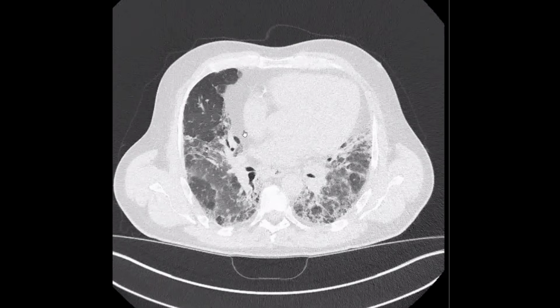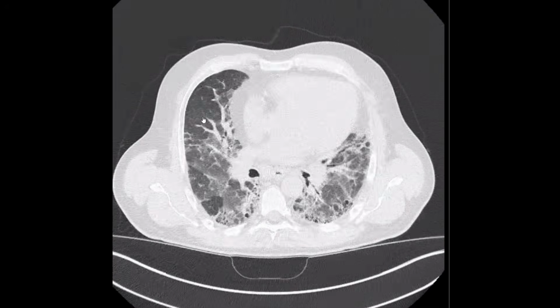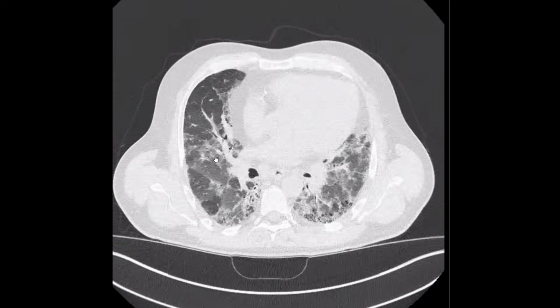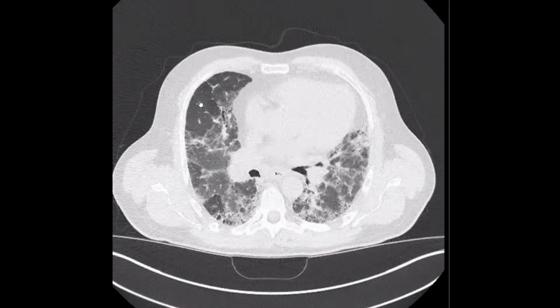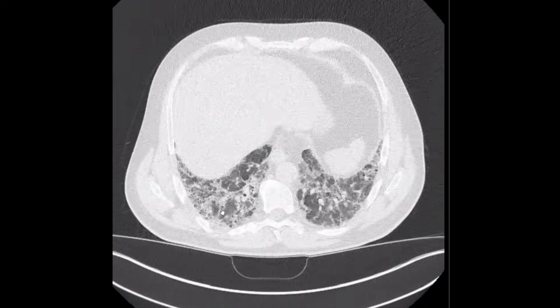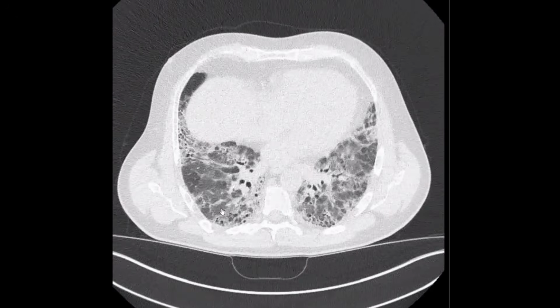The lung tissue should be homogeneous, with higher attenuation in the expiratory phase. This is the normal lung tissue. Once we have these different densities, we have for sure air trapping. And look at these vessels, for example. You will see attenuated vessels inside, not like these areas. These vessels are not attenuated, but these areas are much lower attenuated in the air trapped areas. So if we have any evidence of air trapping besides the interstitial fibrotic changes, we should think of fibrotic hypersensitivity pneumonitis. Okay, not UIP pattern.